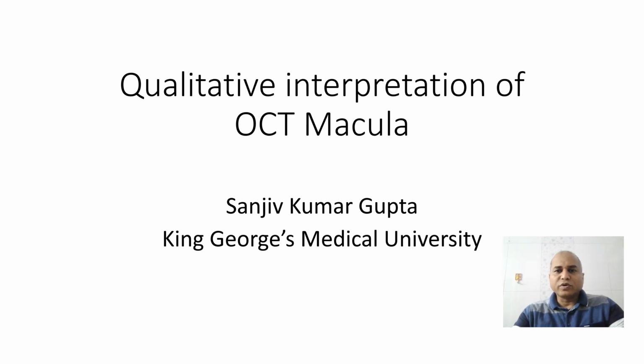This presentation today is about qualitative interpretation of OCT macular, and this is part 1 where we'll just get familiarized with the OCT and the relevant anatomy as depicted by the OCT. So I'm not dealing with the physical principles of OCT and the generations of OCT, but we'll just focus on what the posterior pole retina looks like on an OCT.